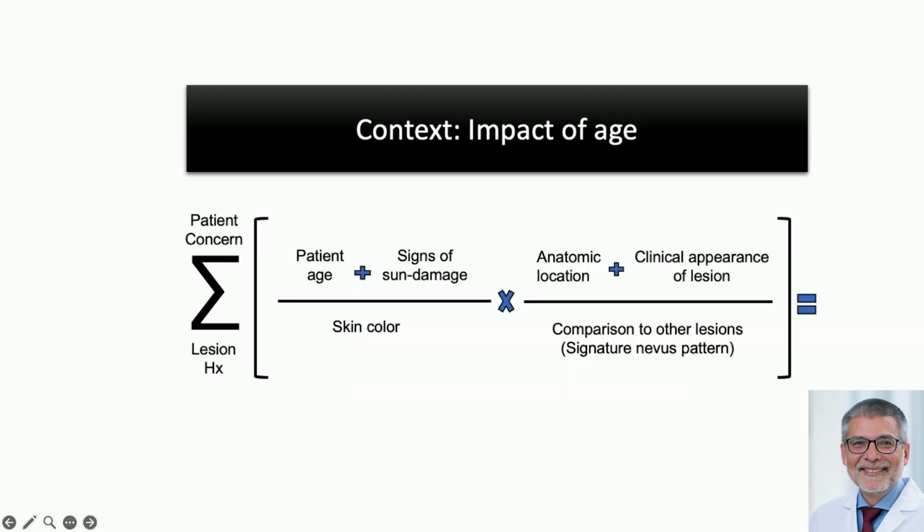So what is the caveat here? The caveat here is only age. That's it, okay? And this is a really important one to keep in mind. Under the age of 12, and we are now fairly confident that we should push that age up to 16, and the new guidelines will probably do that, under the age of 12 to 16, a peripheral streak pattern, the starburst pattern, is benign. You can dismiss it. You can send the patient home.